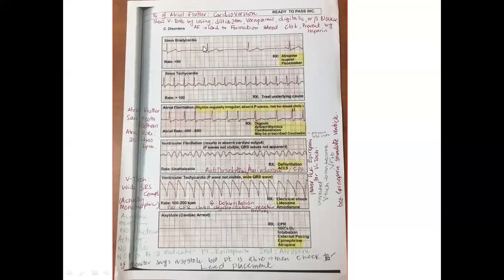How many? 30 big boxes equal 6 seconds. You have to remember that, right? So for the total big boxes, we don't count the small ones. Big boxes we count, okay? How many boxes in between? So 300 divided by the total box number, we can get the rate.